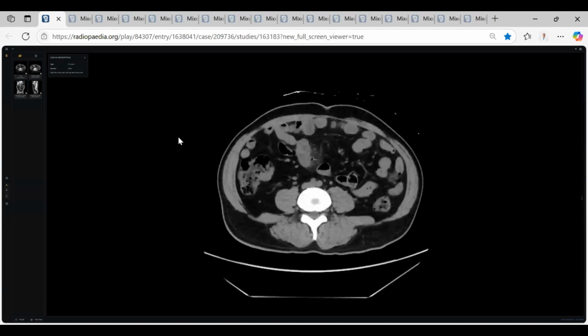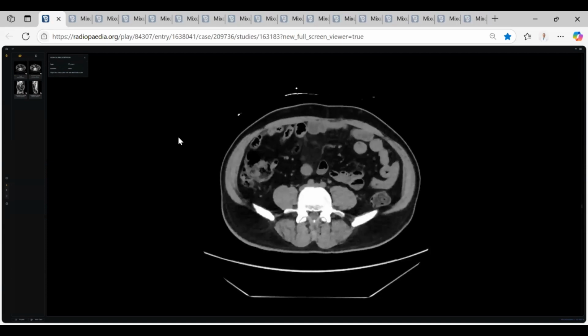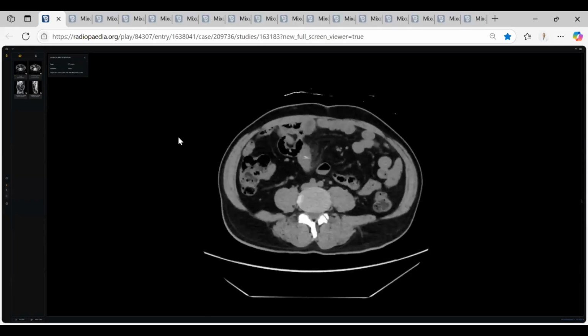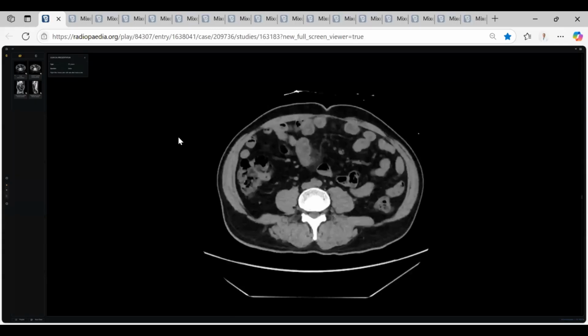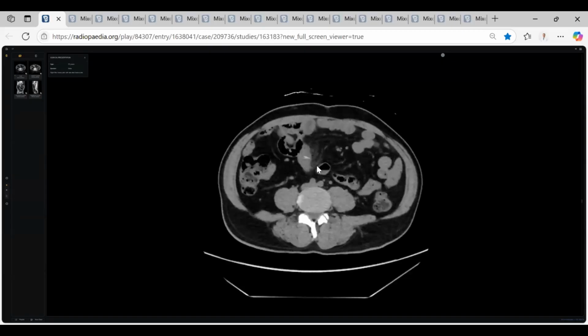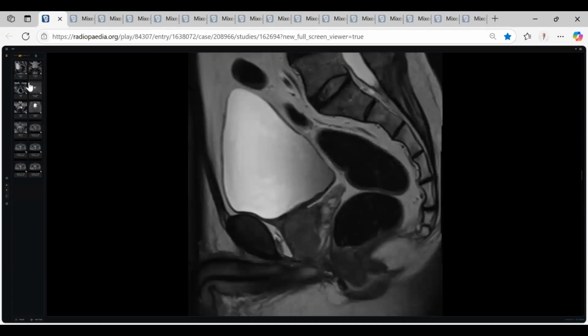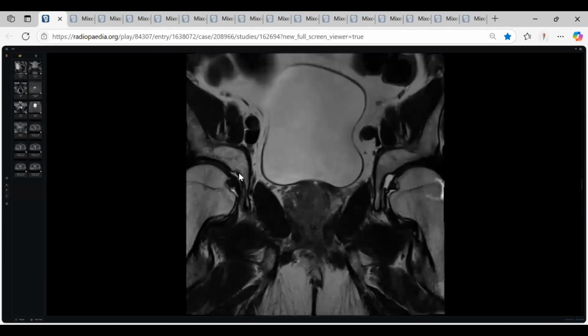An easy case to pick up in this very hard, stressful mixed viva session. A linear dense foreign body causing perforation in the small bowel. There is a focus or foci of gas surrounded by smudging of the peritoneum. So this is a fishbone perforation of the small bowel. Thank you, doctor, so much. She will rule out any considerable pneumoperitoneum. Next candidate.